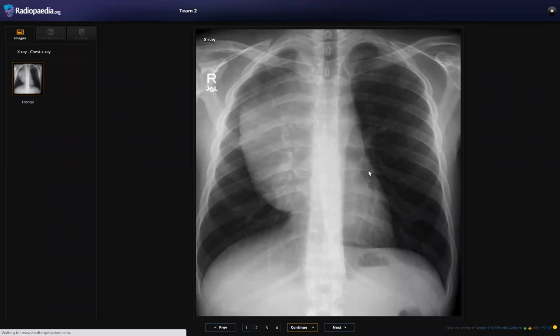Okay, so the frontal chest radiograph of an adult patient. The striking abnormality: I can see there is an opacity in the right hemithorax, which is abutting the mediastinum with an obtuse angle, and I can see the hilum overlay sign. The hilum is visible through this lesion, and I can't really make out the right heart outline, which is obscured by this mass. So I believe it is an anterior mediastinal mass, and the rest of the visualized bones are unremarkable.